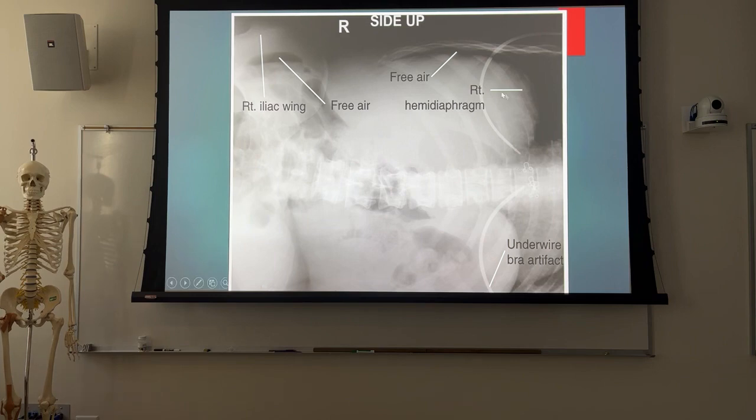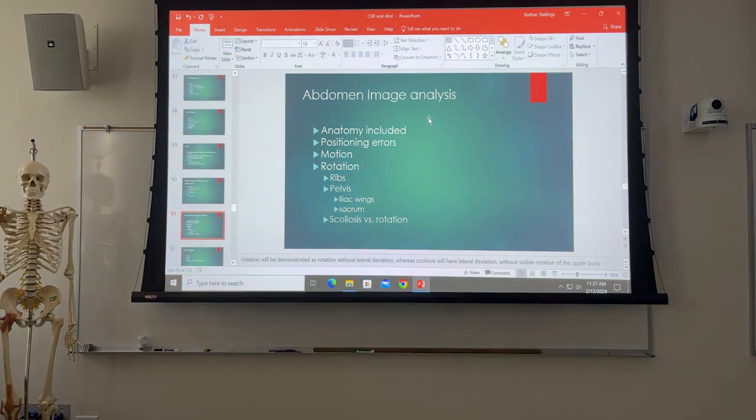So again, repeat that because of the bra? Probably not, unless you've got a radiologist or the tech that you're working with is a real stickler. Looking at the bony structure, this is a fairly young woman, so you really wouldn't want to go back and repeat this and blast her a second time, but you can see the free air pretty well. So, any questions?